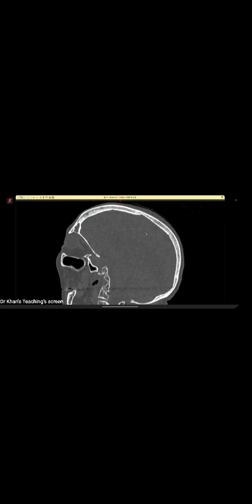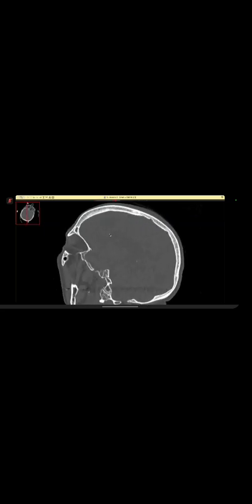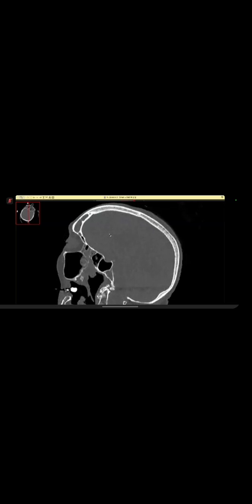And here, the candidate pointed out that there is a bit of erosion, which was very well done. Actually, the frontoethmoid recess is compressed, and that is why there is a secondary sinusitis type of picture. So with passage of time, this might become a mucocele actually.